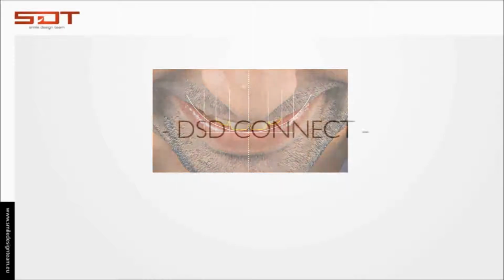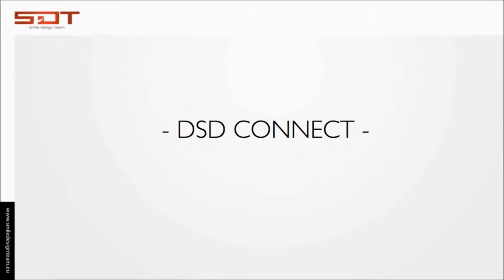At the 12 o'clock profile, the design can also be done only on the incisal edge, but the initial contours of the teeth are indicated to be done as much as possible from the surface of the teeth for a better calibration in the 3D model. The images needed to be uploaded in the DSD Connect software must be exported in certain conditions.